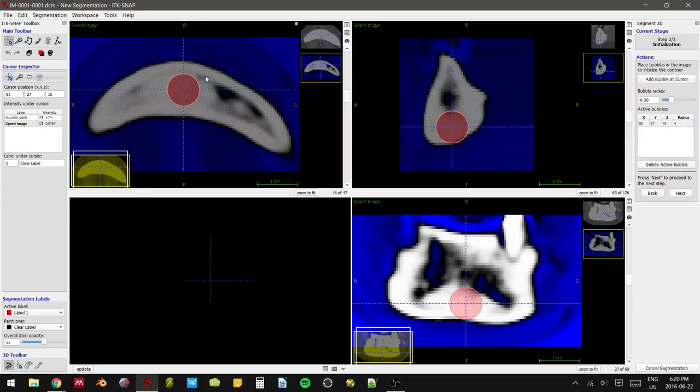In that case, it's not great because we suddenly have parts of our organs that we don't want. So it's for that reason that I do the stepwise region of interest segmentation, like very small region of interest, step by step, instead of trying to get the whole thing at once. If that wasn't clear, I can show you an example of that later or in another video.